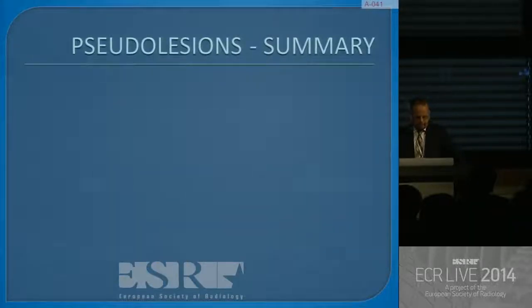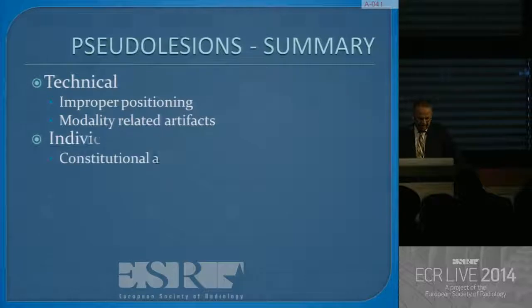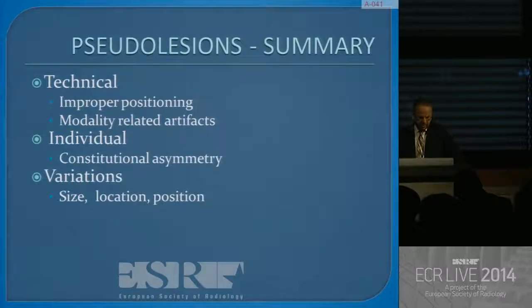In summary, pseudolesions may occur because of technical issues, improper positioning. We have stressed the modality-related artifacts. Constitutional asymmetry may be another source for pseudolesion.